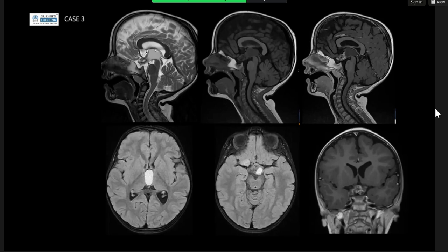In this region also craniopharyngioma, as well as Rathke cleft cyst. However, this is a cystic solid lesion. And the sella is normal, so that's an exclusion for pituitary macroadenoma.